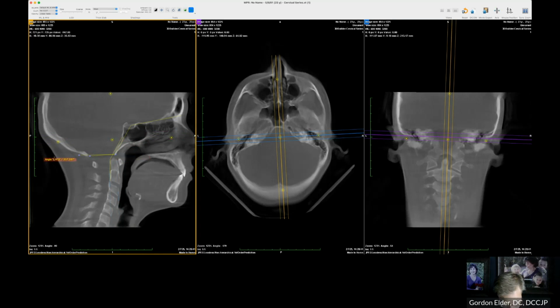this over here. Now if I hit Command copy while it's selected and paste, now I don't have to re-straighten that top line. I always make the top line longer just so I remember which one is my reference angle. So now I have, and then if I go over it and I hit shift and click, shift and click, shift and click, it'll keep all of them. I'll take a screenshot, but I'm not quite done with this view yet. But here we have the sagittal AP plane line, the way that the Blair technique measures it.